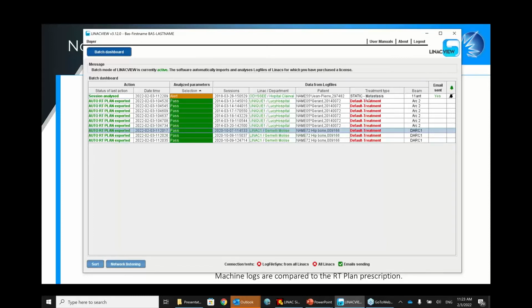It's using a specific template for static plans because this was, let's see, what was this plan that I sent in? I don't have it noted, but it is a static plan.